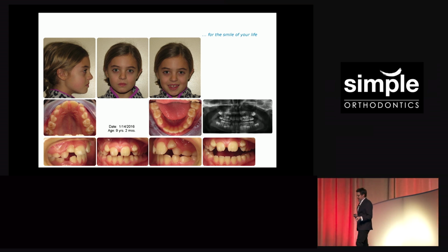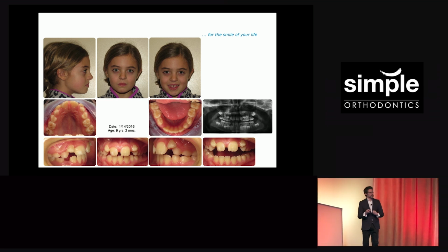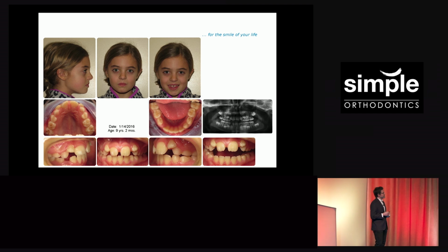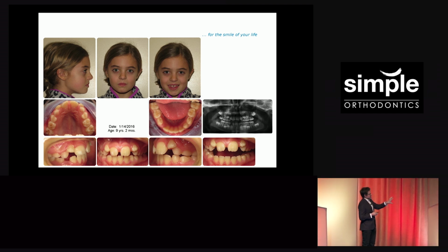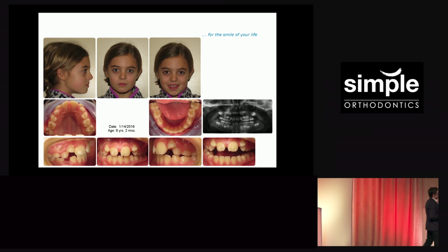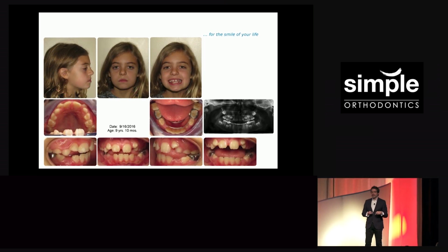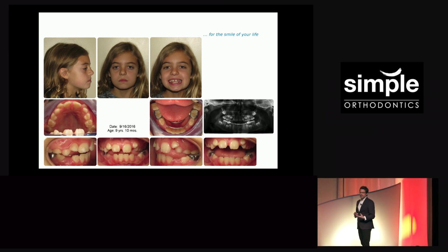You can't really see the pano on this, but obviously, as many of us do, we work in the world of two-dimensional panoramic x-rays, and even if that pano was super clear, you'd be able to see the canines are off course, and you'd be able to appreciate from the clinical photos that Angie is narrow and needs some phase 1 orthodontics.